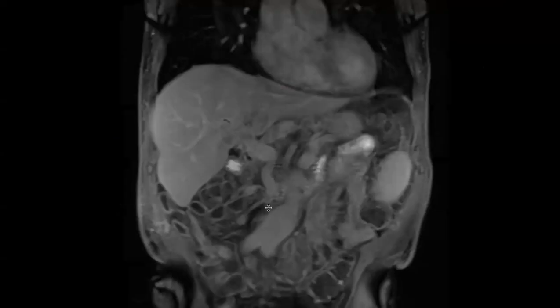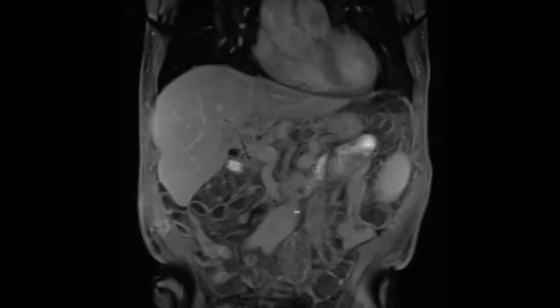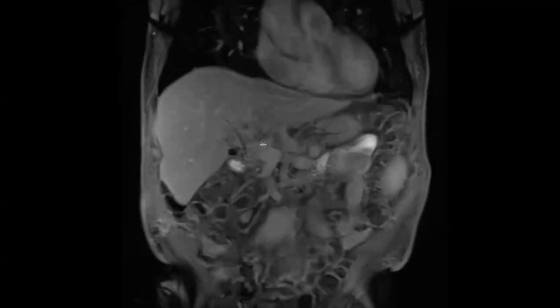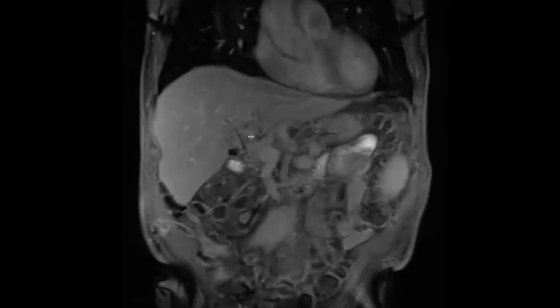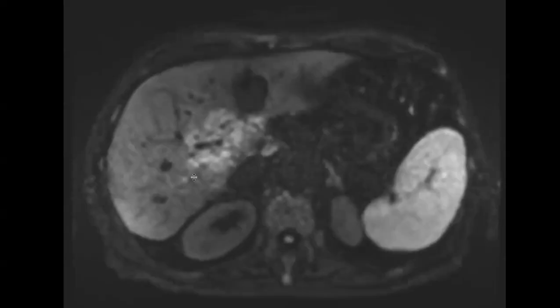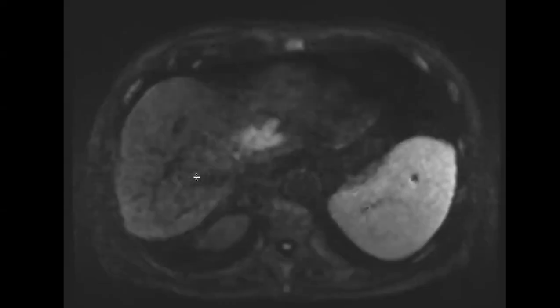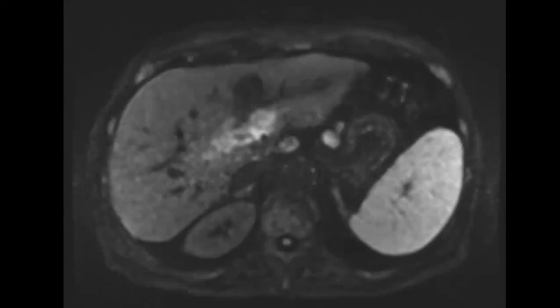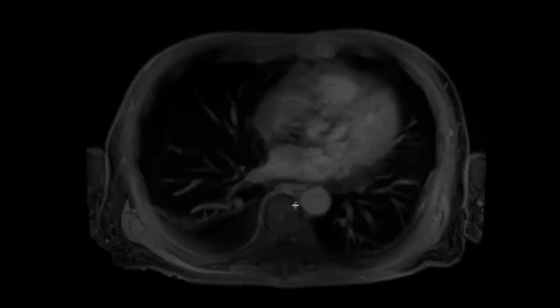And then the MRI showed other findings as well. There's kind of ductal enhancement, but there are also these areas of geographic hypoenhancing region. Here's the diffusion. These all restrict, with corresponding low ADC. PTLD. Okay. Aarti, what do you think? I want to see the venous. Yes. So PTLD is a great thought. And here's the 5-minute venous.